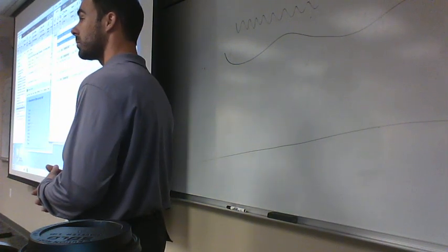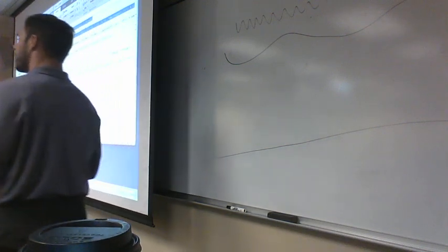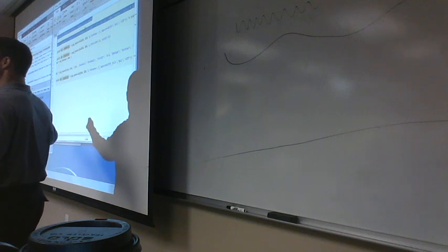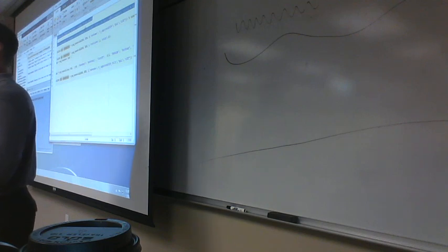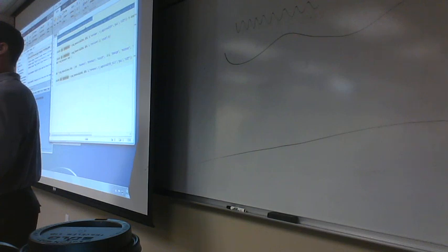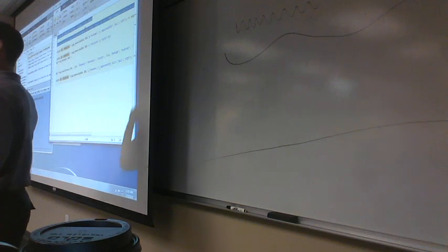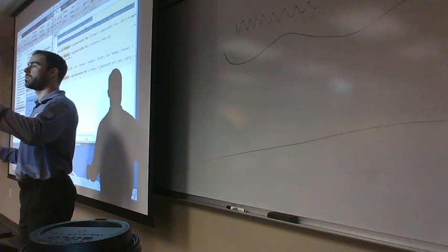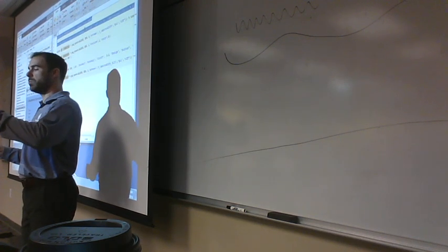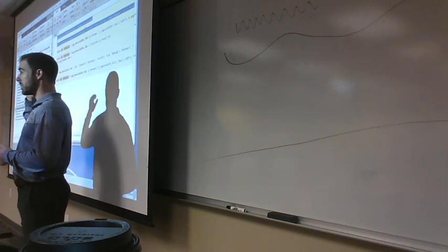Can you just run the whole thing? You can do the whole thing, but we have a couple spots in here that I basically didn't want to run. So I just wanted to show you stuff section by section, because a lot of times this is also a way that you troubleshoot a script. Sometimes you'll get a script, or you'll be writing one, and you'll get error messages, and you'll be like, this doesn't work. The way that you troubleshoot it is you evaluate section by section, and you say, okay, let's just try this section. Okay, this works. All right, let's go down to the next section. You keep doing it, and that's where you find out where the error is. So that's one reason why I just did it spot by spot.